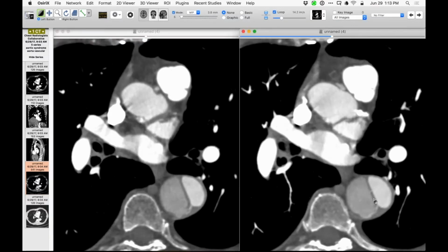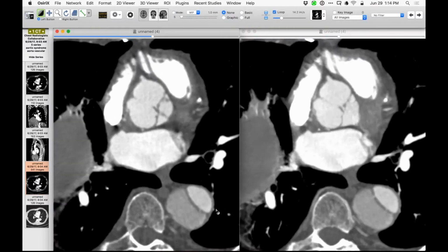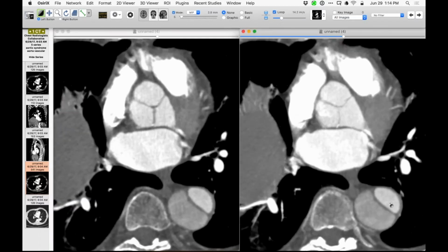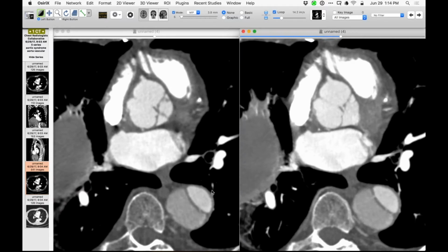Again, to my eye, what I perceive is seemingly a little jet right there, right there, and there, and right there. And Howard, that one in particular, you can actually see it going all the way through the false lumen. It sort of goes like that. Yeah, you can see that. You have the contrast just right that it's easy to see that little jet.